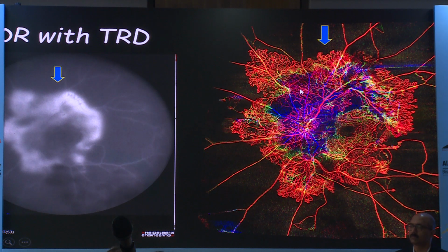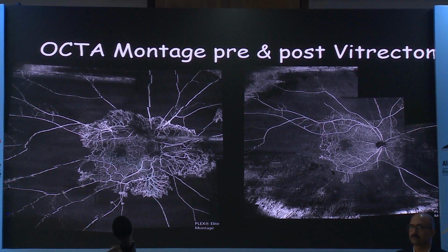This is the OCTA image on one side, and the FFA on the other side. It's a gorgeous image. It won the ASRS award. It was called the flame of the forest. So, something interesting. These are the other cases where we use it.